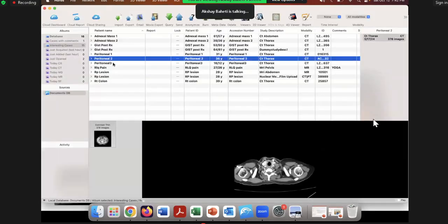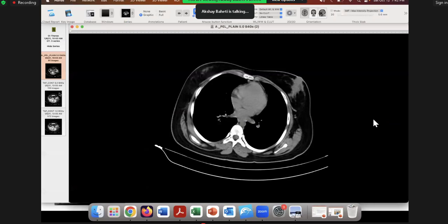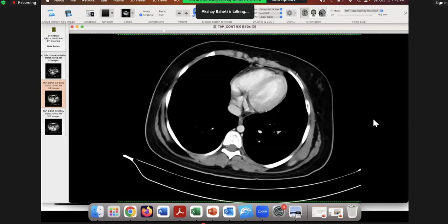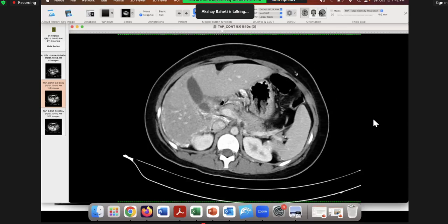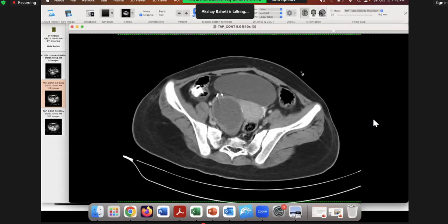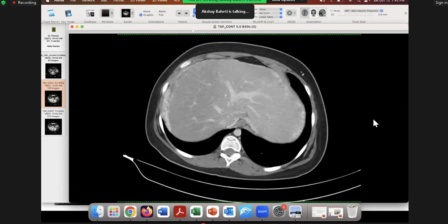So the third case is slightly different, and maybe you can continue because Aparna spoke for long. Here there's just one thing to know, more than anything else. Again, you see disease. This is also ovarian cancer, but there's something different here. You don't see a lot of disease below, that's the right adnexal mass, and you see something here. So what's happening? What is different here?